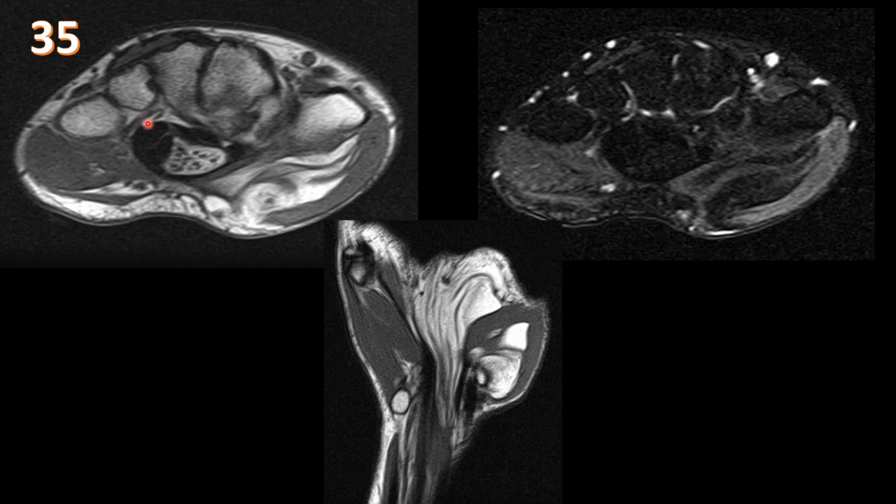Case 35, we have axial T1 and T2 fat sat images of the hand as well as coronal T1, and we see that there is fatty enlargement of the median nerve, which is within the carpal tunnel. This is the carpal retinaculum and the flexor tendons, and we see these nerve fibers look like cords within the median nerve that have been kind of displaced and surrounded by fat. We know it's fat because it's high on T1 and it diffusely suppressed on the T2 fat sat images.